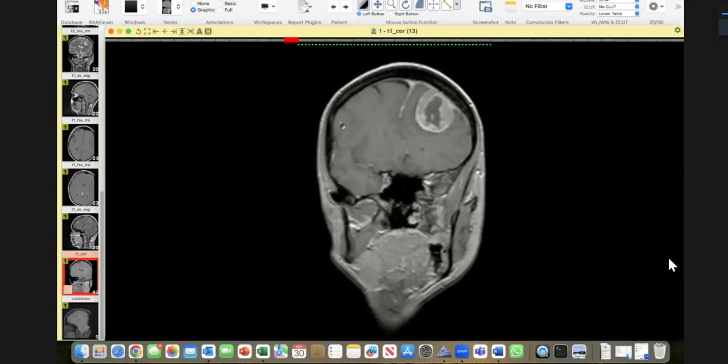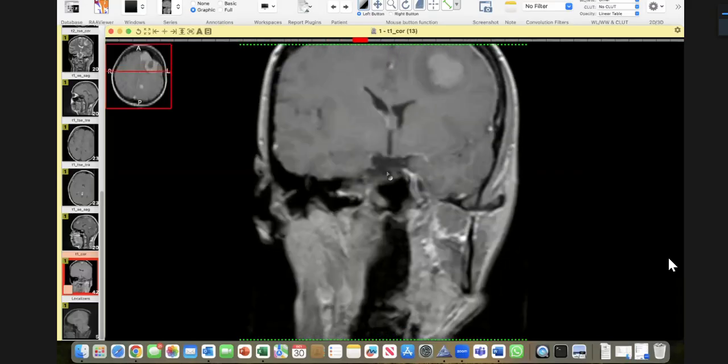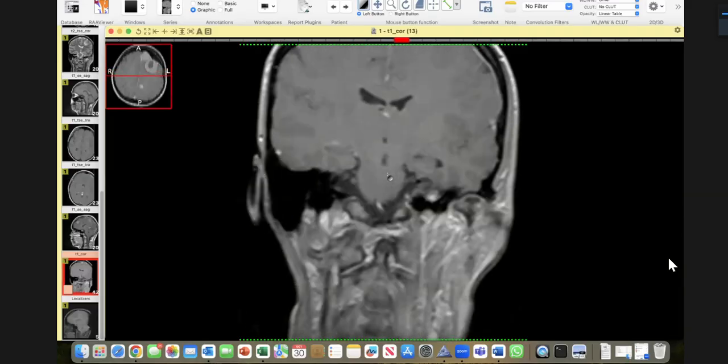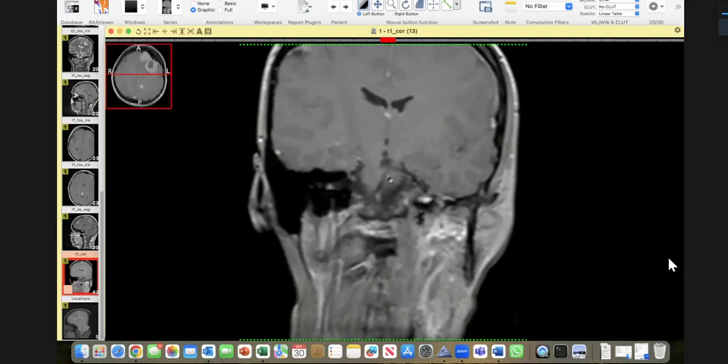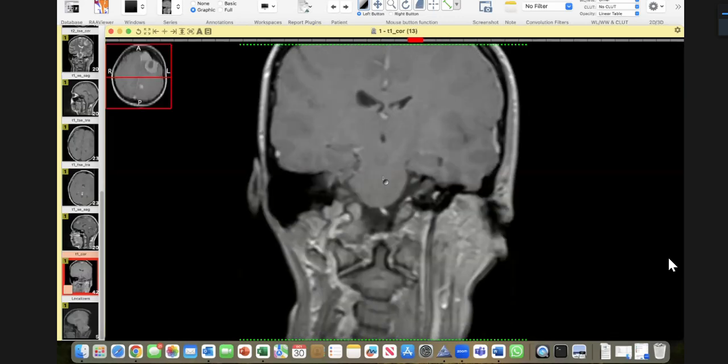Actually, that was an ependymoma in the ventricle and acoustic schwannoma. I gave you a hint. Look for that. And you did not. And the point is that it would have been a good practice to ask for, I want to magnify it. That was the key in this case.